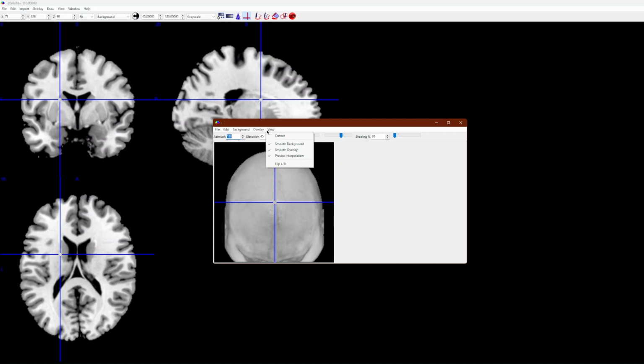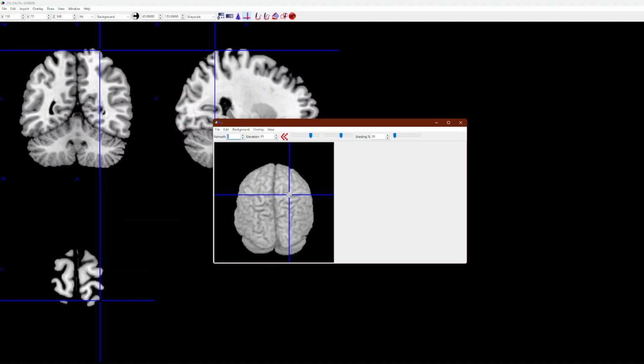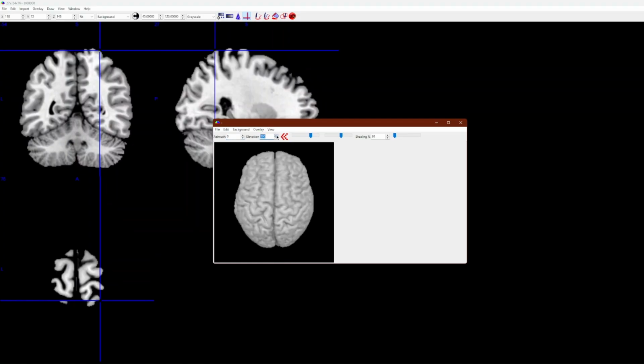It can also show 3D lesions, create presentation-ready figures, display overlays like VOIs, like we talked about earlier, or statistical maps like the fMRI. Key controls. So what does the azimuth do? Azimuth rotates the brain left and right. And then what does the elevation do? Elevation rotates it up and down, used to orient the 3D view.